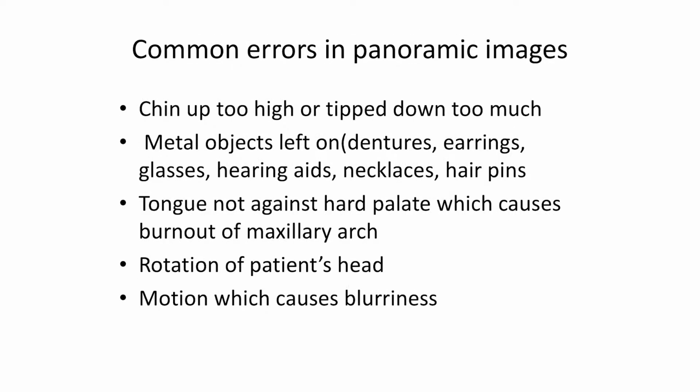So common errors in the panoramic images: if you have the chin up too high or tipped down too much, or the metal objects left on. If you don't have the tongue against the hard palate, it causes burnout on the maxillary arch because there's an air gap above the tongue. That air gap gets overexposed, and then you are not able to see the apices of the maxillary teeth. When the tongue is pressed flat against the roof of the mouth, it attenuates some of the x-ray, so you don't get the burnout.